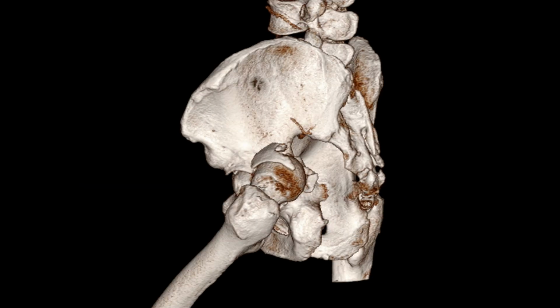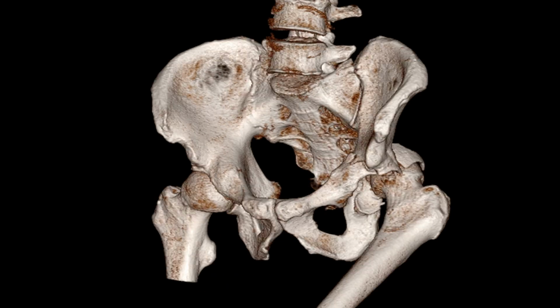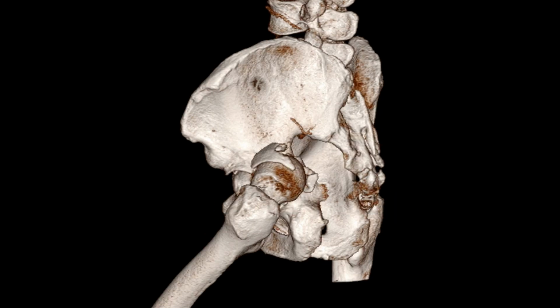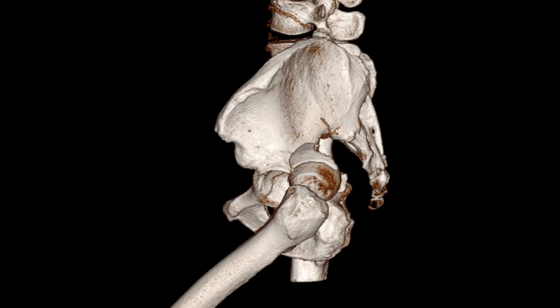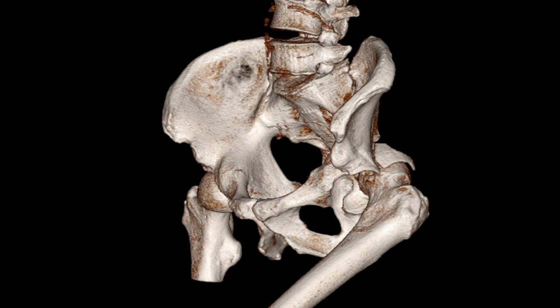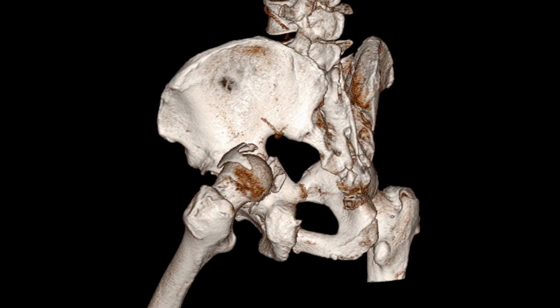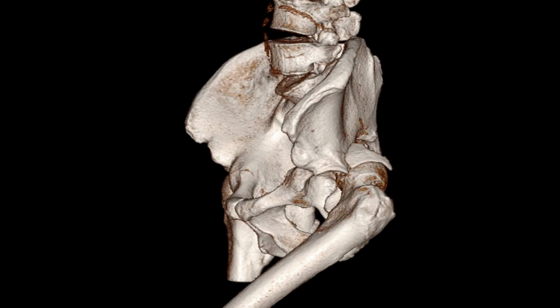And I think I'm just going to leave this up for a little bit so you can think about this concept in relation to this patient. So this is a patient who got into a motor vehicle collision. Knee hit the dashboard, and so it dislocated that femoral head out the back. And as you can see, as the femoral head dislocated out the back, it just shredded that posterior wall of the acetabulum. And until that posterior wall is repaired, that femoral head is going to be unstable and can fall out again.